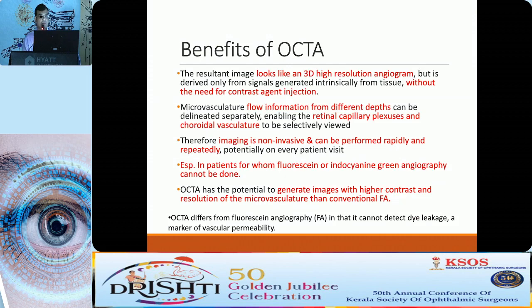But OCTA, since it is a 3D resolution and goes very deep from the superficial layers, can show you very definite layer by layer. It can be repeated at every follow-up to see the improvement or worsening in the retina and choroid both. It generates images of high contrast resolution, much better than fluorescein angiography and ICG, and patients who have allergy to these dyes can be imaged, so it is a very important imaging technology.